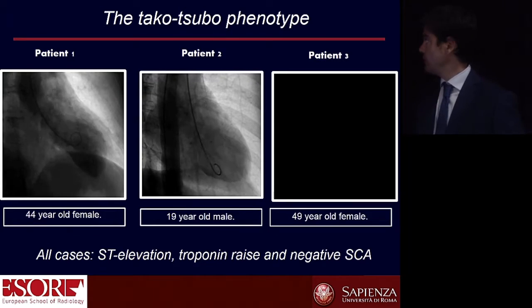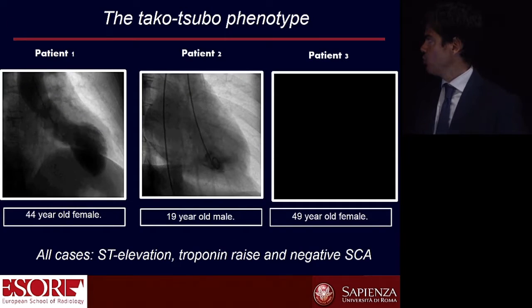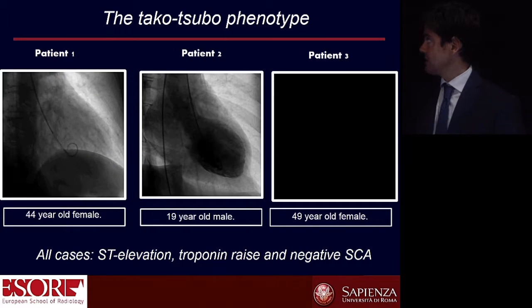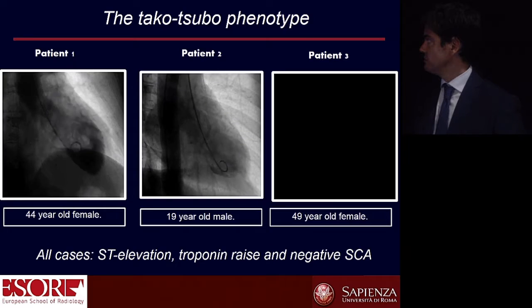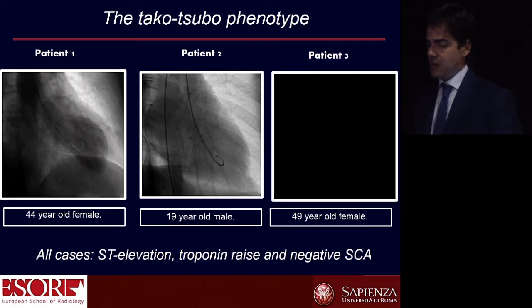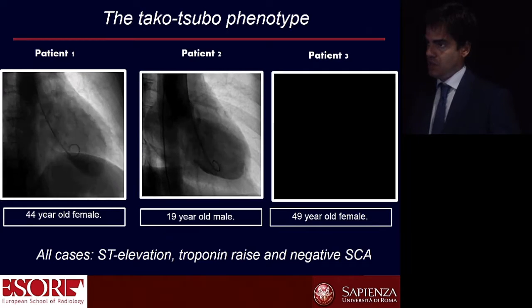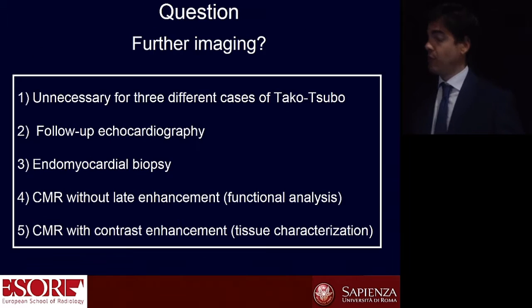which is exactly corresponding to the Takotsubo, in which what happens is that there is a remodeling of the apical part of the left ventricle. I just stopped the movie here, which is enlarged with hyperkinesis of the basal segments and akinesis of the apex. All these cases, I won't ask you, were directly interpreted to be Takotsubo, and colleagues didn't ask for further imaging.